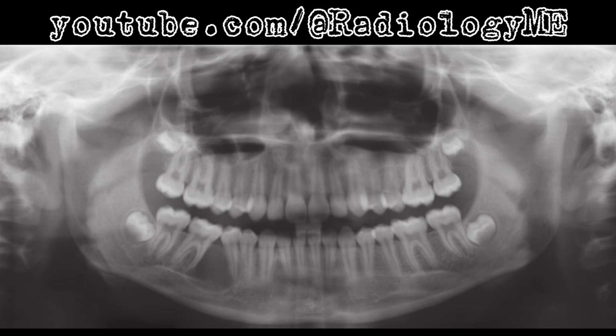Here we have an orthopantogram, OPG, of a young adolescent, and the first thing I notice is a well-defined, unilocular, rounded, cystic lesion in the right hemimandible. It's measuring around 2 to 3 centimeters in diameter and is located between the roots of the lower right 5th and 6th teeth. Both teeth are displaced laterally, which is a key feature, but importantly, there's no root resorption noted.